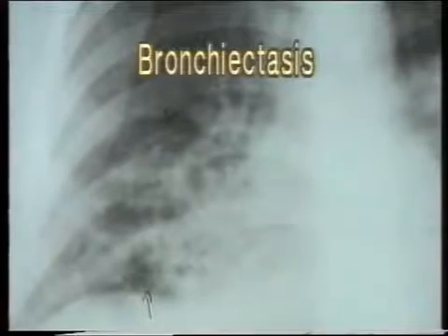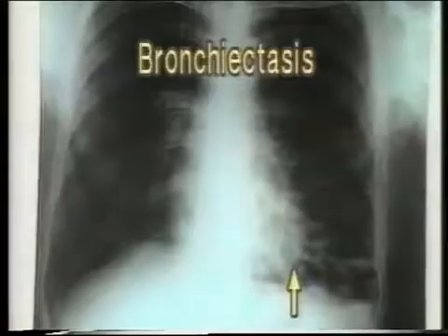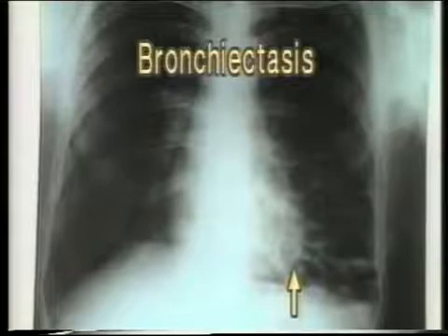The cysts are very thin-walled and some may contain a fluid level when in the lower lobes. This is another X-ray of a patient who presented with chronic cough with copious foul-smelling expectoration.